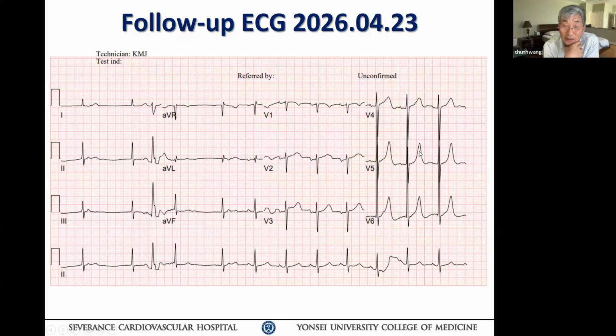you cannot say there is evidence that this regular rhythm that you see on the bottom line is a sinus rhythm. What evidence do you have that after the junctional rhythm and some PACs, you start this regular rhythm?